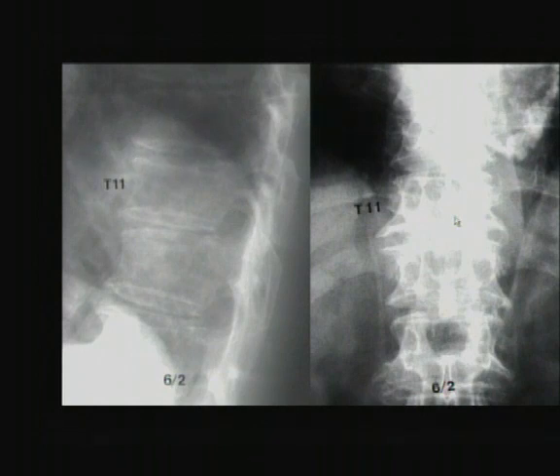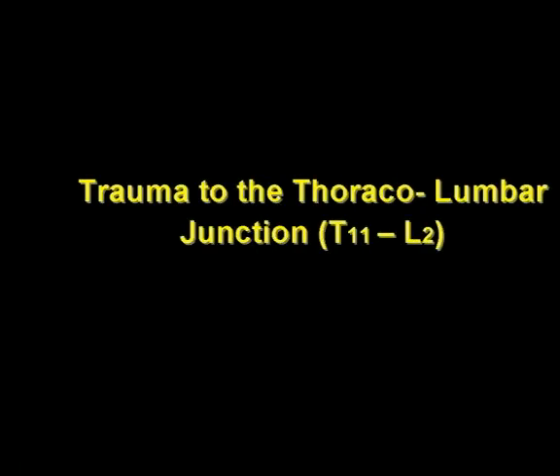Another patient, an elderly patient working in the yard, fell, came to the emergency room in June, and we looked at this. Everything looked fine. He had focal pain there. We sent him home. He came again. There was nothing. Came again. Boy, we became worried. Somebody decided to do a bone scan, which was positive, but noticed no collapse. And then when we brought him back 2 weeks later, he had the collapse. So delayed collapse is a real entity. Keep it in mind if the pain persists, okay? And if you know about it, it could protect you a little bit.